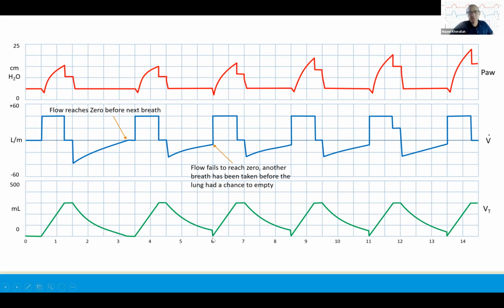It's the wave that you see. This is inhaled volume, and then we try to exhale. We don't exhale everything. There's still remaining volume, which is in the lungs. And this is indicated by persistent flow at end of expiration. So this is the trapped volume of the gas.